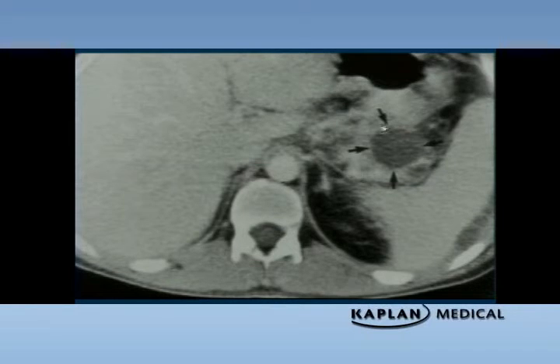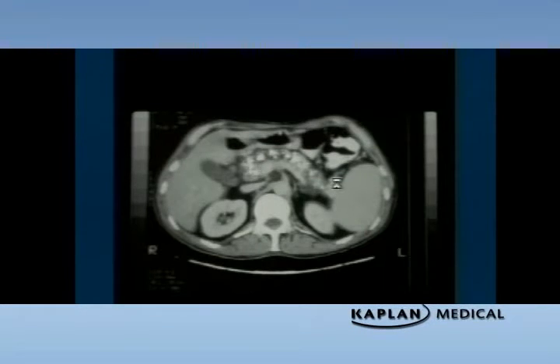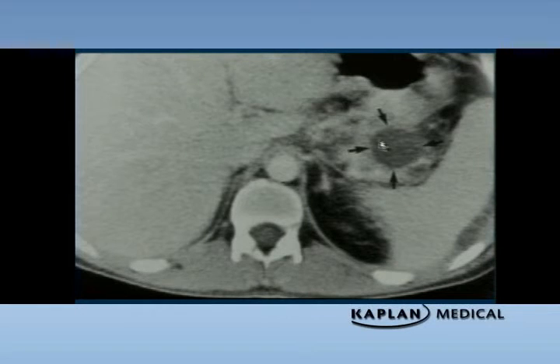This is a pseudocyst. You'll notice that there's no wall around it. It must be something. Look at those arrows. You would not get this by itself, if it wasn't for the fact that I showed you chronic pancreatitis and pseudocyst. Crus of the diaphragm, rib, rib, rib, vertebral body, spinal cord, blood vessel, liver, pseudocyst.